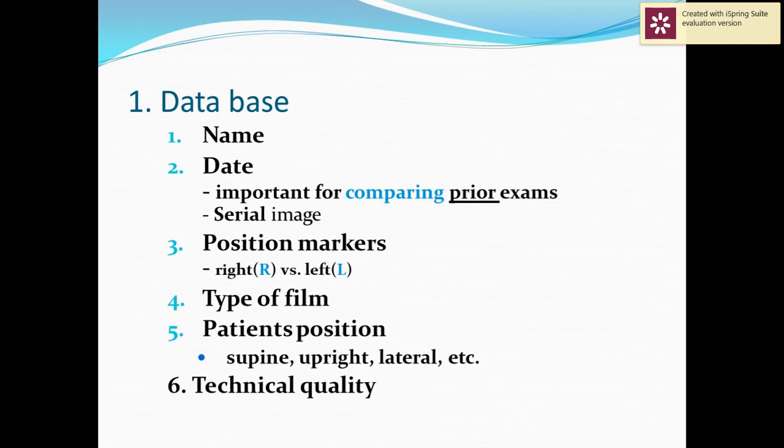We will also check type of the film and also technical quality.